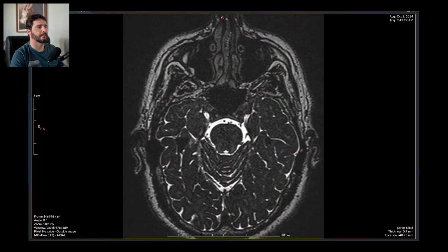It says this patient, a male patient, 59 years of age, has asymmetric hearing loss. He has a previous exam of about 10 months ago, and the previous exam was normal. Maybe it's not.